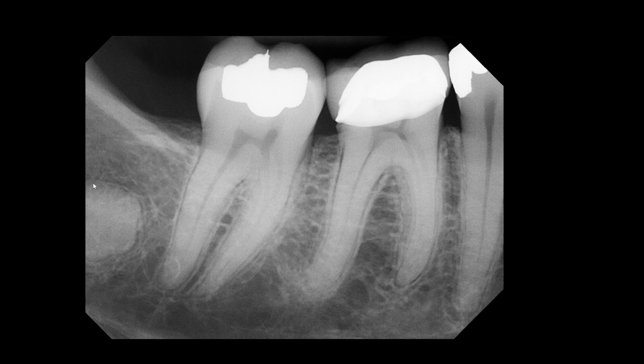The fact that you're seeing this well-defined radiolucent rim should help you to rule out osteosclerosis. Osteosclerosis is also known as dense bone island. Essentially, it's just sclerotic bone, a dense area that can occur in the maxilla, the mandible, and any of the bony structures.